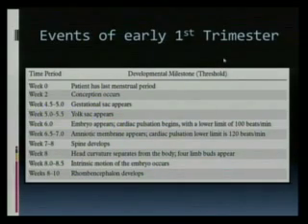By 6.5 to 7 weeks, you must see the amniotic membrane appear. So Ibrahim, to answer the question, the yolk sac will always appear before the amniotic membrane. Make sense? So the amniotic membrane appears. The cardiac pulsation should now be measurable with M mode. And at that time, the lower limit becomes 120 beats per minute. Does that make sense?